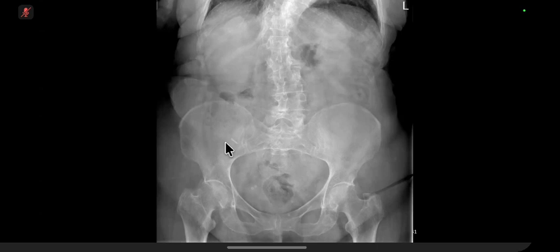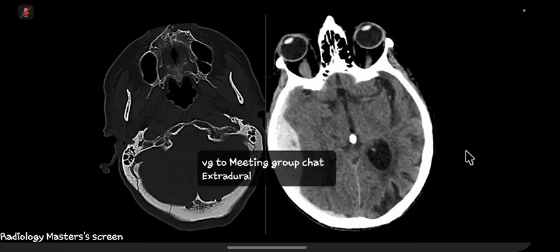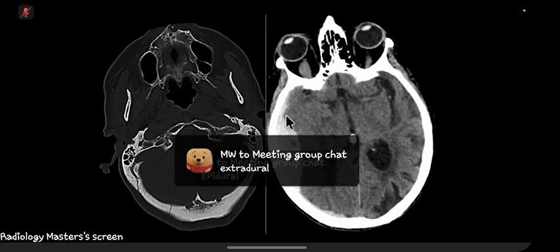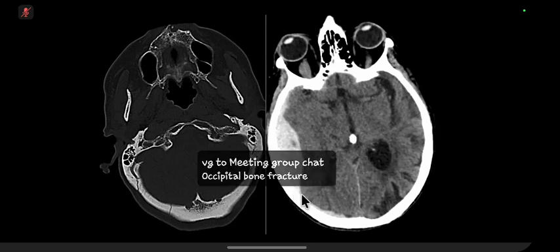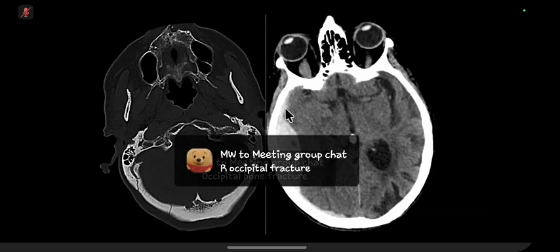This patient has suffered a head injury. So tell me what sort of injury they've got. Yeah, they've certainly got an extradural, okay, because there's the coronal suture, there's the lambdoid suture, but they've also got a subdural collection in addition to an extradural.